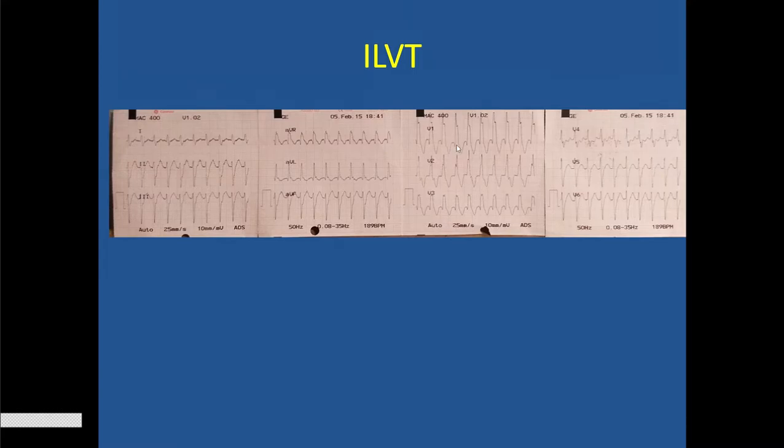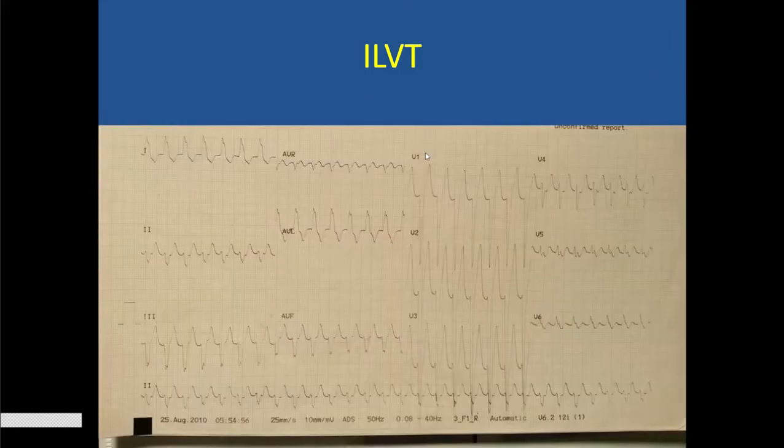Supraventricular tachycardia with aberrancy of RBBB type would have a right rabbit ear taller than the left rabbit ear, number one, and the axis would be rightward rather than leftward. And negative complexes in V5, V6, all these point against a supraventricular tachycardia. So this is a VT, even though it appears relatively narrow, right? So RBBB with leftward axis, think of a VT, which is idiopathic or a fascicular VT.